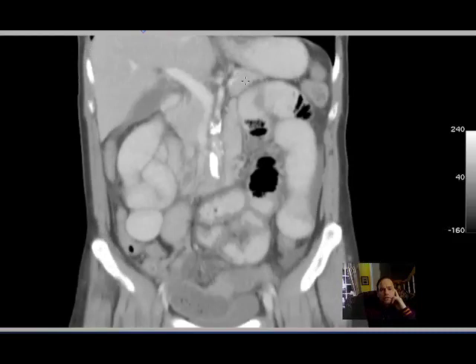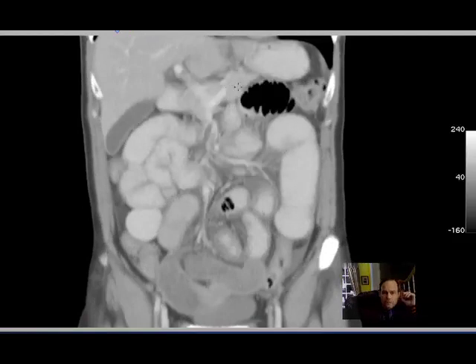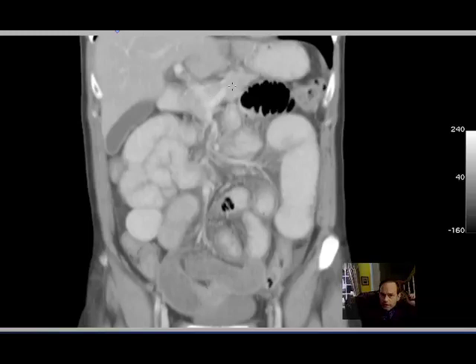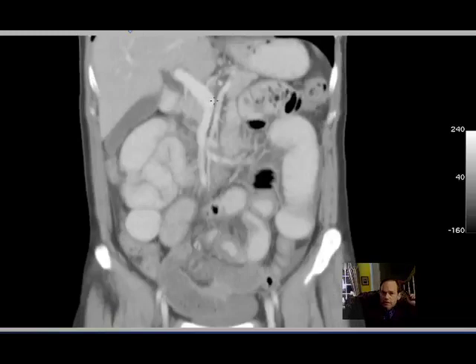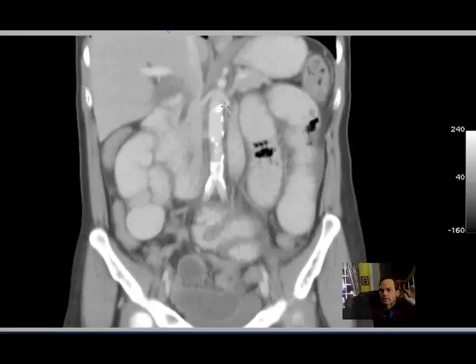Unusual. We can see that this is pancreas. That's splenic artery. So it's hard to see. Here, it's coming over like this. And we just kind of lose it. So here you can see it's just kind of anterior, a little more anterior right there. That's where the convergence of splenic vein is arising and continues off that way. So this is splenic vein and this is splenic artery. And they got so close to one another, it was a little difficult to distinguish one from the other.